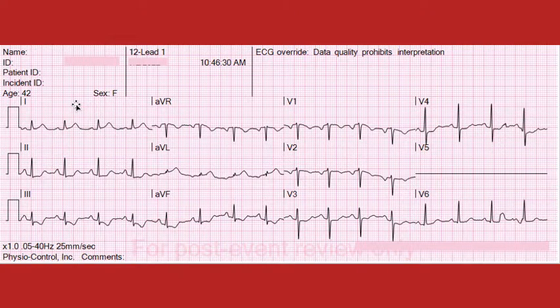Now, do we see any dramatic ST segment elevation? No, we don't, but there are good examples here of T-wave hyperacuity in leads 1 and AVL. These T-waves are large, they're robust, there's a significant area under the curve, they're bulky. The proportionality is such that the T-wave completely outsizes the respective QRS that it's paired with.